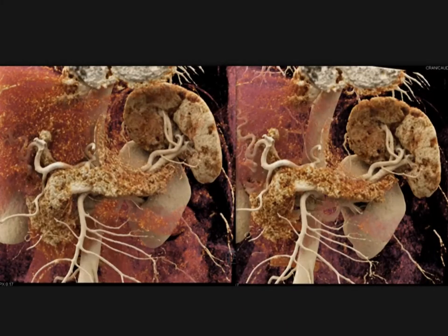Now, this is not an image of the heart or aorta, but I just wanted to show this to talk about the fact that we look at textures. I gave a talk last week on CTisus talking about 3D imaging of the abdomen. This is one of the slides I showed, but it does make the point that the lighting model can be used to accentuate vessels, texture in the gland, the spleen, liver, etc.